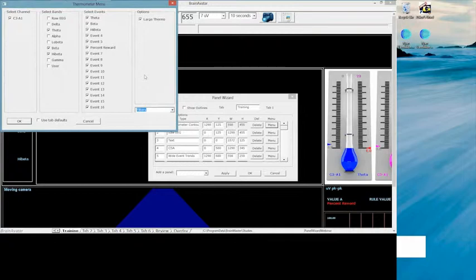Each display, well, almost each display, about 90% of the displays have their own specialized menu. And you have to ask yourself, well, what's the reason for this? The reason for this is this allows you to customize even further. This allows you to display information maybe not being trained. It allows you to display information that is being trained. It allows you to display event information. It allows you to customize your screen to basically have additional information that you may or may not want to see.